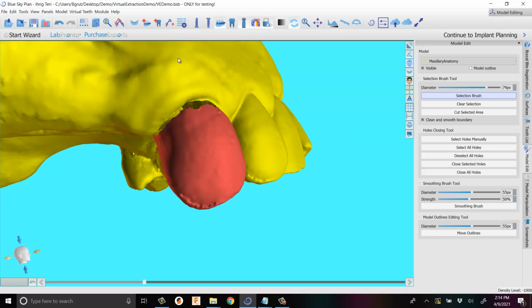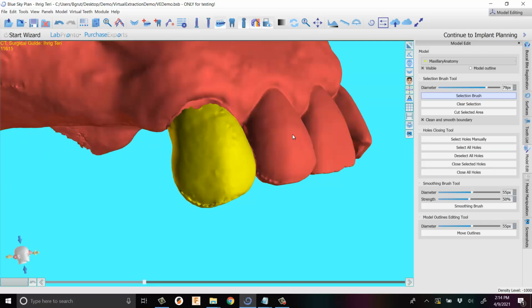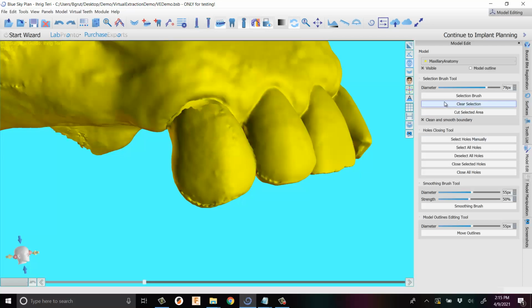Since it's not connected, it didn't highlight the entire model. Whereas, let me hit Control Z to undo that. If I double click over here, everything else gets selected. Pretty simple there. Control Z. All right, let's come back.